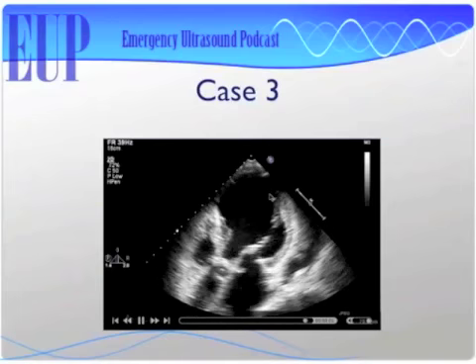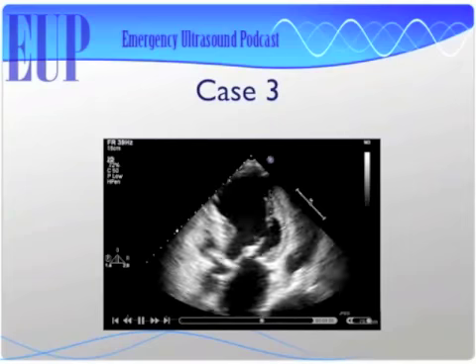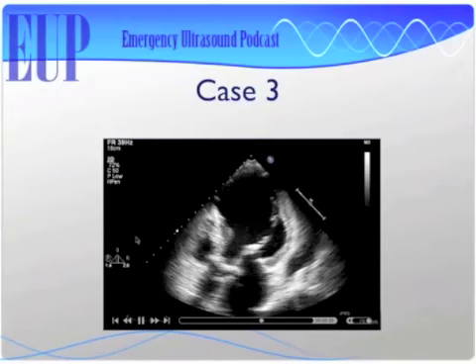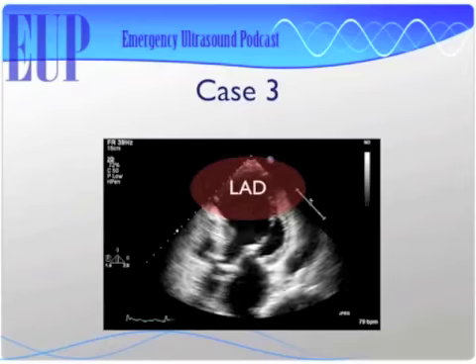I just like saying kinesis words because I think they make me sound intelligent. Akinesis, dyskinesis. You can talk about that all day long, but in any case, this is your LAD, which is down.